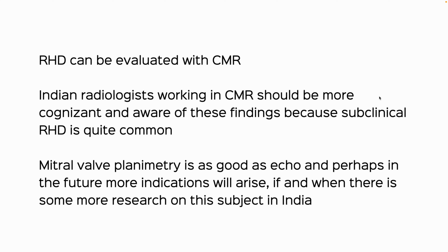But irrespective, I think we should at least know what the mitral valve looks like in rheumatic heart disease with cardiac MR, if nothing else. And then maybe over the next few years, some bright young radiologists and cardiologists will tell us why we should, or which are the specific indications where MR really helps in such patients.